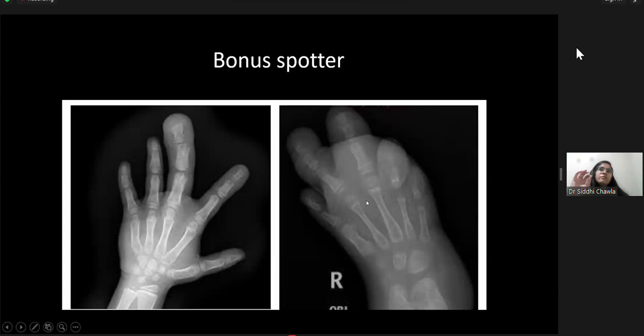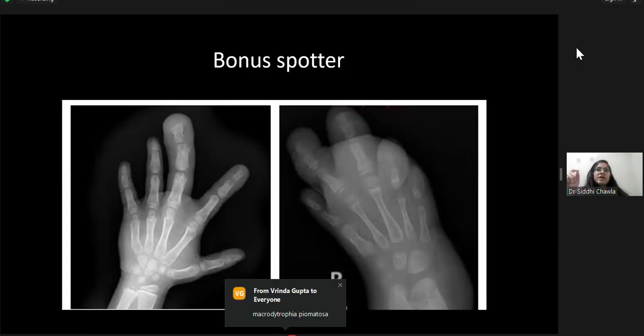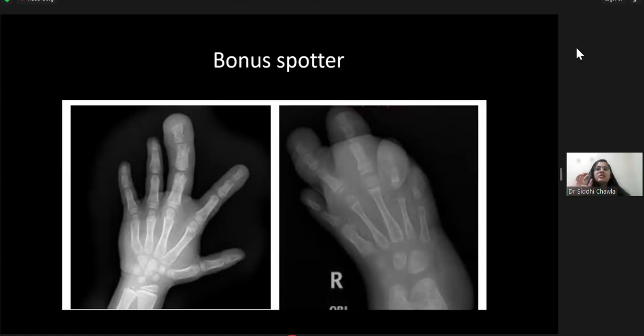One important thing that I want to tell you is that you should not assume that macrodystrophia lipomatosa just has increase in the lipomatous component. It is actually the entire mesenchyme, the entire soft tissue, the muscles, the subcutaneous fat, the bones in a particular dermatome, all of them are involved. Do not get confused with the name of the lesion. It is a form of localized gigantism, right? So this is a very important spotter and a very common one also. So just remember it.